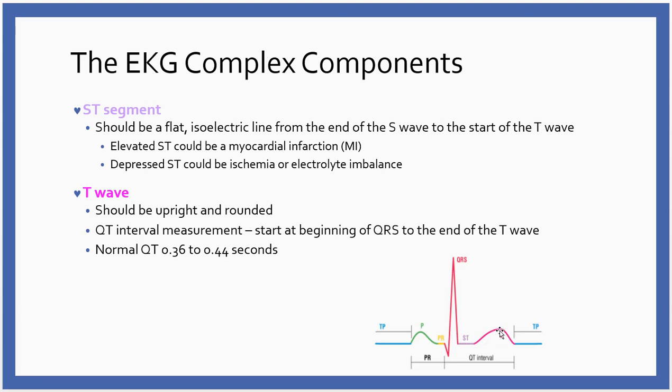But from the peak of the T wave to this baseline here at the end of the T wave, this part right here is called the relative refractory period. This is a sensitive time in the T wave. And if I had a ventricular ectopy, and it's typically a PVC, that lands on the back of the T wave, my heart can respond, but it's typically not normal.